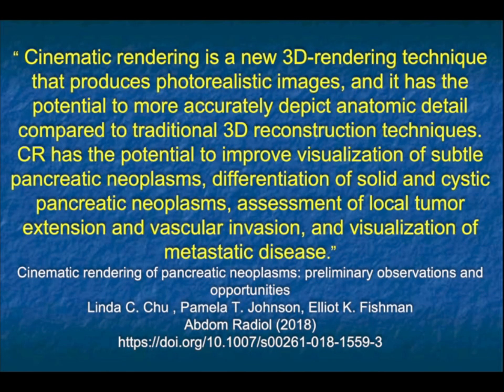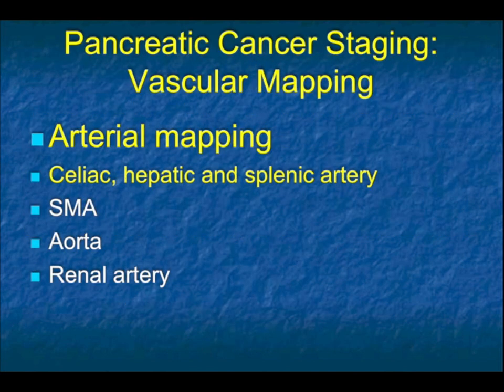Now, cinematic rendering, I've mentioned it a few times and showed you a few images. It's something we've been using for the past 4 years. It's volume rendering, but done with a better lighting model, and so it's more photorealistic. It has the opportunity to improve visualization of subtle pancreatic tumors, differentiation of solid and cystic tumors, assessing local spread, both on the vascularity side, as well as looking for mets, including areas like the liver.